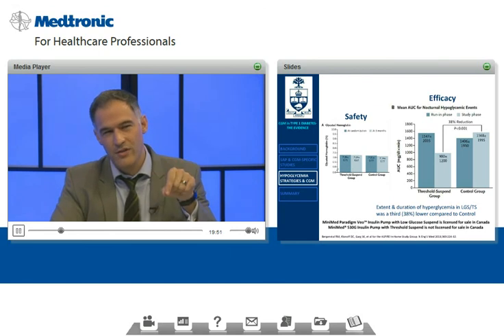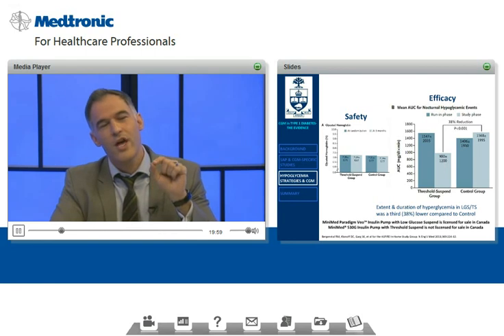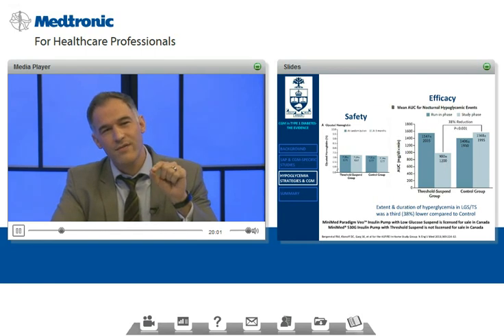Those are American units, milligrams per deciliter. So in our units, we would divide by 18. So the 980 and 1568, that's about a 600 difference. It's in minutes, so if we made it in hours, that would be about 10. And 10 in milligrams per deciliter is roughly half of one of our units.